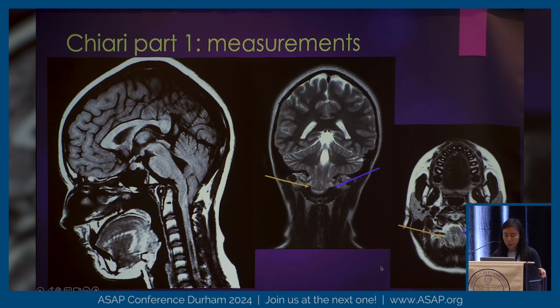So in terms of measurements, this is a different patient that obviously has different anatomy at the craniocervical junction. Their clivus almost looks like it's laying flat instead of slanted, oblique, like we just saw. And their odontoid is retroflexed, is how I would describe it. It's pointing to the back. And so in terms of McRae's line, where I draw it here, you can see the brainstem and the cervical medullary junction looks very strange compared to the prior one.